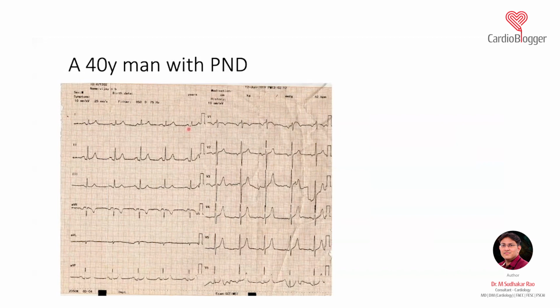Now the most important thing you should not miss in this ECG, which is a gross finding: can you see this lead V1? In lead V1, the P wave is usually always positive. So what does this negative P wave in lead V1 suggest? And if you see lead 2, this is a very gross finding. The P wave is a hump, a camel hump shape.